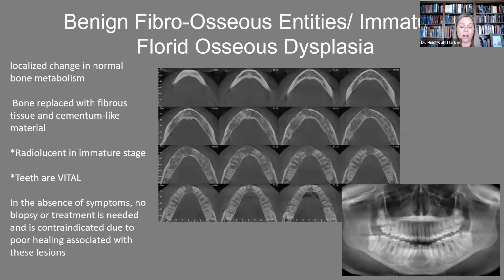Again, radiology, we just state the facts. We're going to leave it as that. But you always kind of wonder in the back of your head exactly what happened with that, if perhaps that would have been a misdiagnosed entity. And you sure hope that's not the case. But in radiology, again, we just state the facts as they are and move along. It's not for us to sit and try to guess what happened.